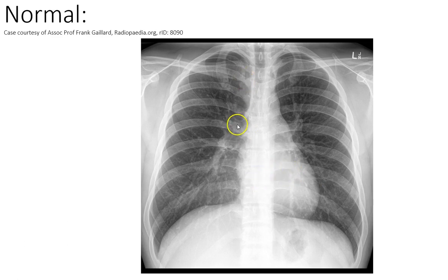The next thing I look at is I look at the lung markings, and I check that I can see them all the way to the edge. Now if you can see the texture here, this is where there is no lung markings versus the texture here. You can see the difference in the textures, and I'm looking to see that this texture extends all the way to the outside of the rib cage, all the way to the outside there. Okay, and next I look at the lung fields. Okay, and I'm just checking my way down, seeing if there's anything of significance.